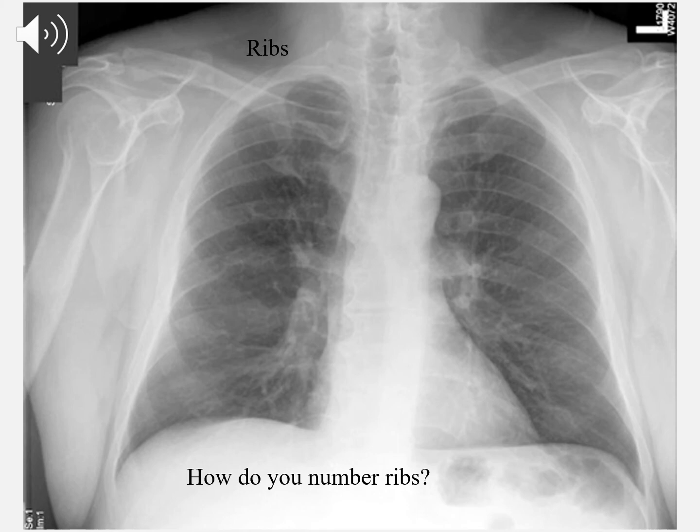How do you determine the ribs being posterior versus anterior? Again, you can look at this and try to determine which ones are superimposed on which. So you see the ribs starting out of the spine. Just, for instance, look just below the clavicle on the left. That rib goes out horizontally, and then it curves around towards the front, curves around and goes down.